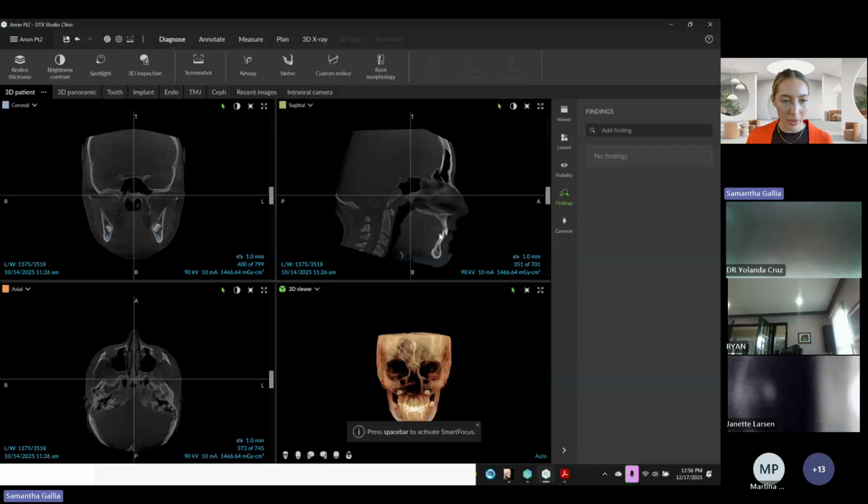All right. Are you seeing my screen? We can see it. Okay, good. Thank you. All right. So we have a patient loaded up, and this is on our DTX software.